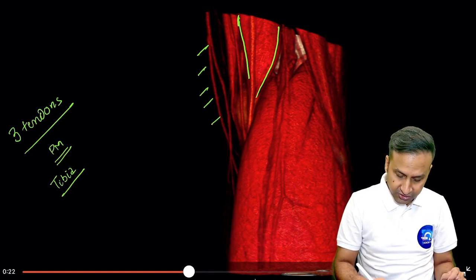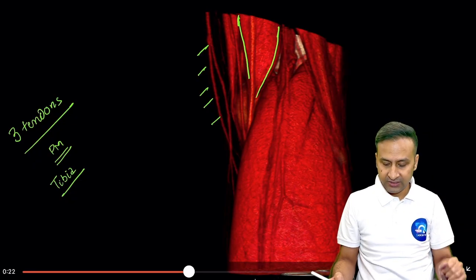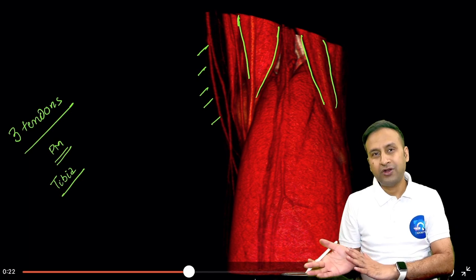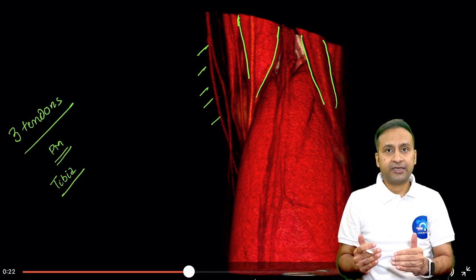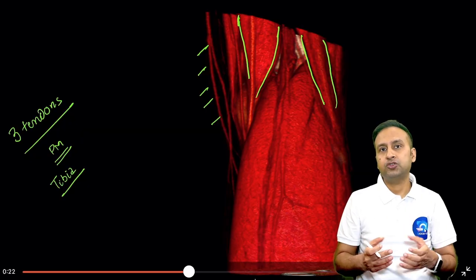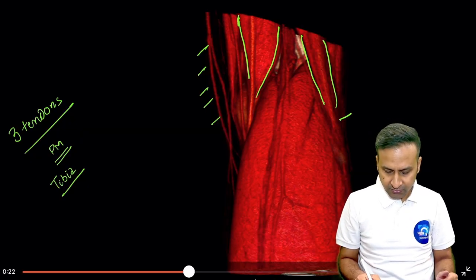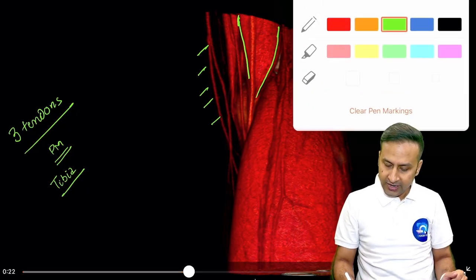This is a fleshy muscle which is located along the posterior aspect of the knee joint, more so along the posteromedial aspect. And I can also see a muscle which is now forming a part of the posterolateral compartment of the knee joint as well. Both of these muscles again are crossing the knee joint to go and insert over the tibia, or in this particular case, perhaps in the region of the fibula, that we'll see once we rotate this particular image a bit further.